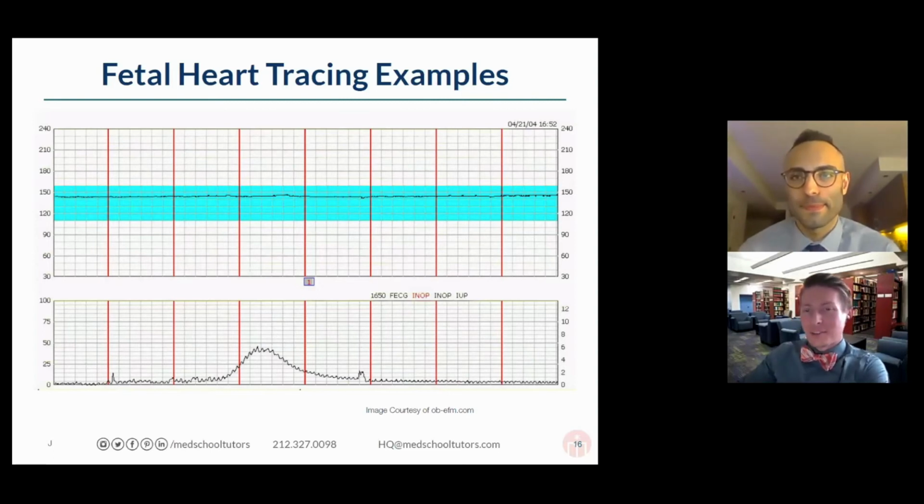Basically, yes, you zap the baby, put a cell phone against the abdomen of the pregnant woman and give it a call, and that should wake the baby up. Now, we're not necessarily going to do that while the woman is in labor per se, but this woman who has perhaps one Braxton Hicks contraction here is likely coming into your clinic for an antenatal checkup, and you're going to do a fetal non-stress test in order to assess the safety and well-being of the baby. In that case, you would need to see if the baby has accelerations, and you can't see those if the baby's asleep. And so this is where we might wake that baby up.